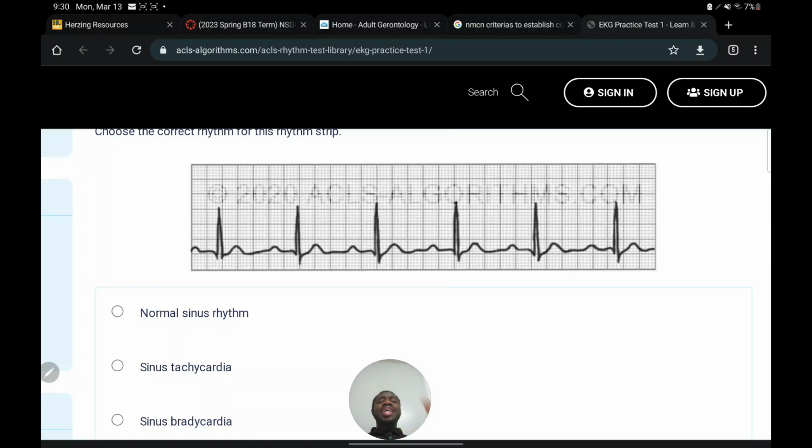First-degree heart block is recognized by a prolonged PR interval. Another way to note that is that the P wave is too far from the QRS complex. When you calculate the PR interval, which should be between 0.12 and 0.2, the PR interval is 0.32. That means it's prolonged, so this graph shows first-degree heart block.